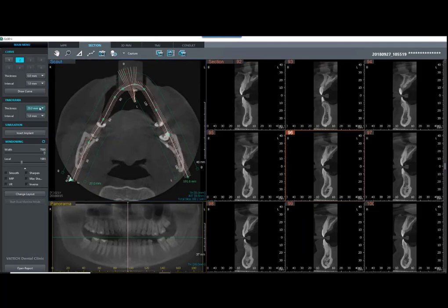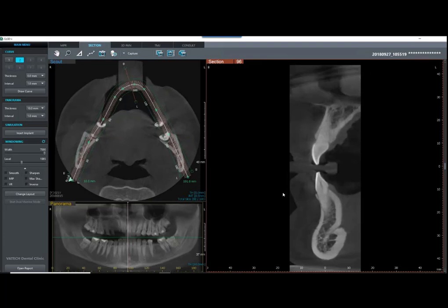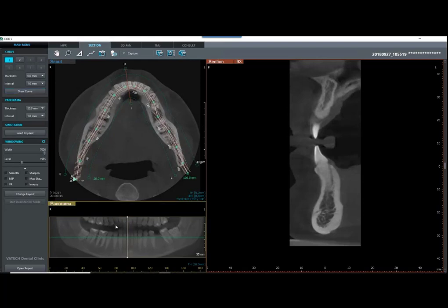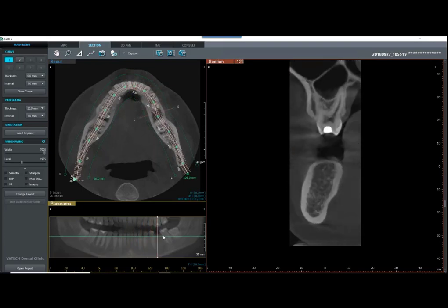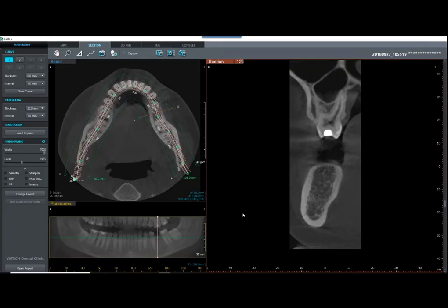Right, I'm going to go ahead and change these back down to our 10 millimeters. And Paul, I'm going to go ahead and double click here, and let's go up to the first curve we drew. So you notice I have two curves now. The first one is focused more on the mandible. Notice I do have the opposing occlusion here. So I'm going to grab with the cursor here, and let's drag this over to site number 19. Move this up here, and we can see our slice.